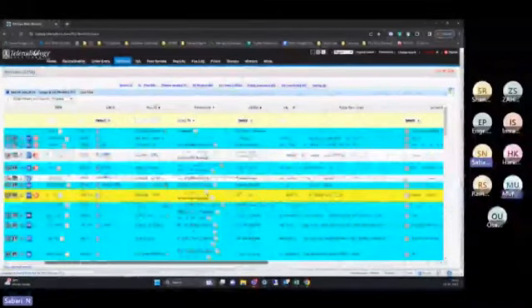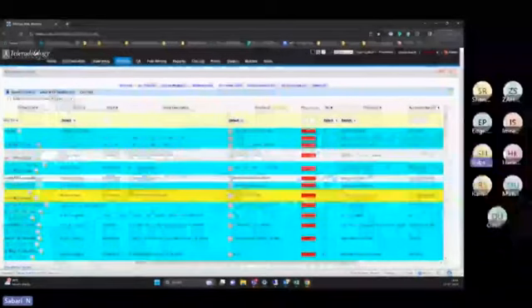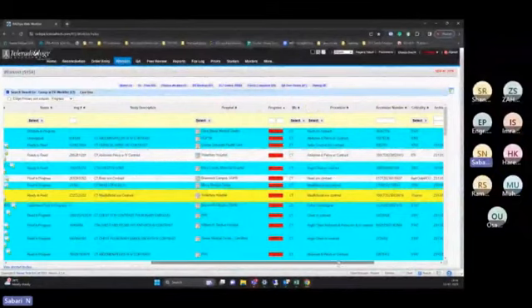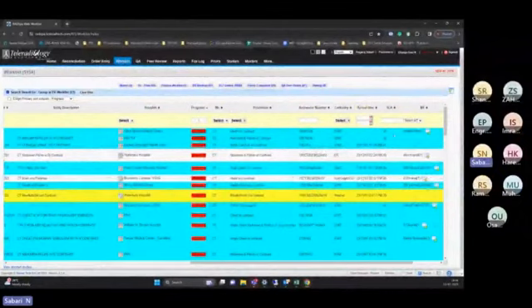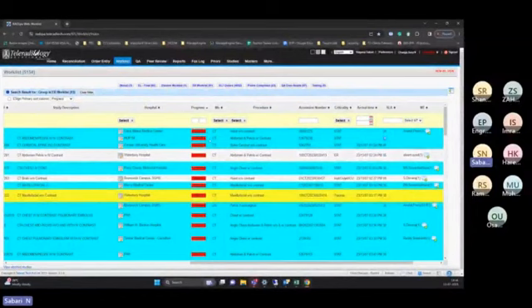And the rest is patient demographic details, the patient medical record number and ID, patient, radiologist, status, images, study descriptions, hospital, progress of the scan, what type of modality, what type of procedure, accession number, criticality, arrival time, SLA. SLA means service level agreement: in what time we have to do the scan or the report, whether it is less than 30 minutes, less than 60 minutes, or less than 45. Based on this time, the color code will change.